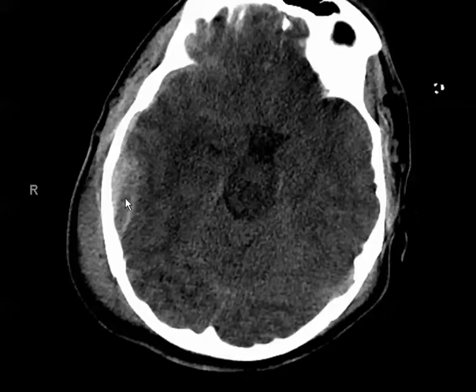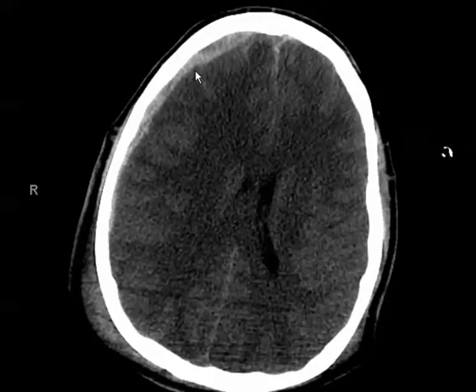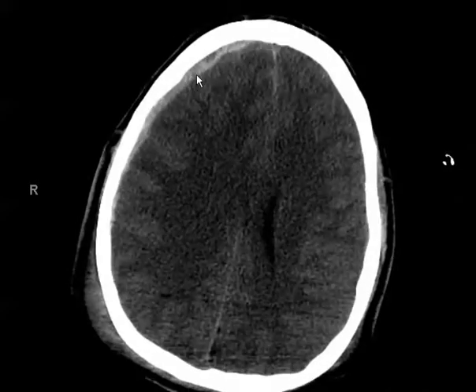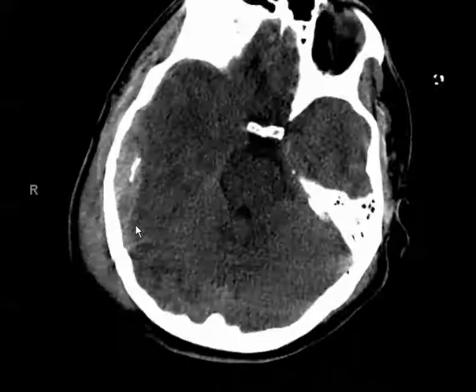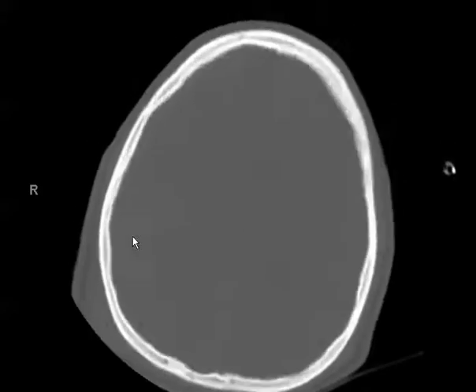Epidural hematomas are usually a result of tear of the middle meningeal artery, whereas subdural hematomas are usually a result of tearing of bridging veins. Subdural hematomas can cross suture lines but typically do not cross the midline, whereas epidural hematomas can cross the midlines but are confined by sutures. Epidural hematomas are usually associated with skull fractures, as we see in this case.